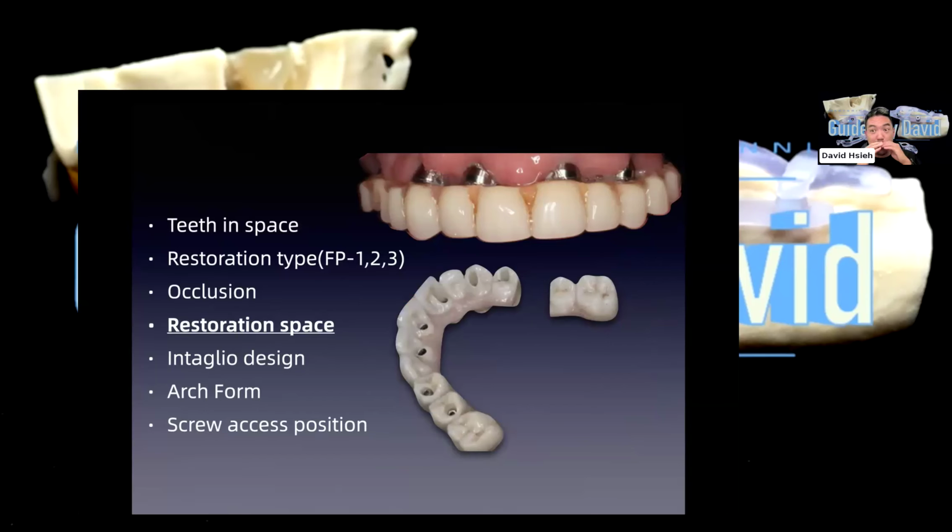Even though there's no bone resorption yet, you need to look at the patient, because there will be a line called the transition line. It's the line between the prosthesis and the patient's biological soft tissue, right? Ideally you try to hide that transition line behind the patient's lip when they smile. If the patient smiles a lot and you can see it, you didn't plan it right.